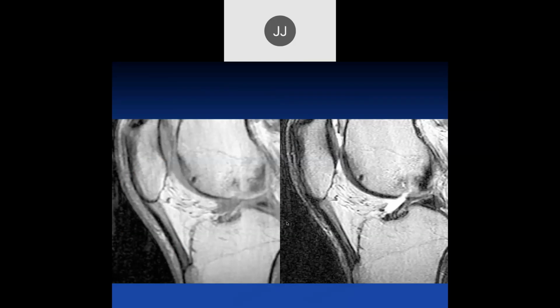That's just about ready to tear from the patella, and that's not a good thing to get. If it's fixable, it lays you out for about 6 months to a year.